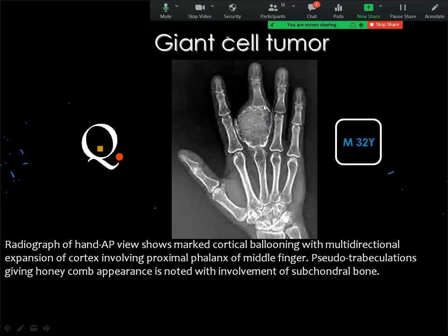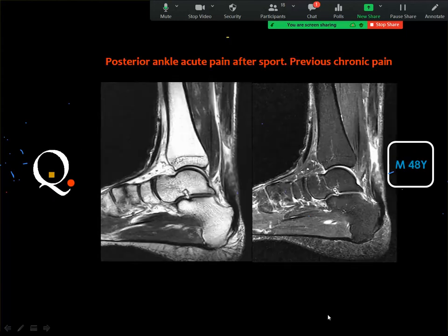The giant cell tumor may contain some trabeculae inside, but actually I went through the literature and I could not find a single criterion that can differentiate between enchondroma and giant cell tumor. So, in cases where the age is above the age of epiphyseal closure, then you may consider also giant cell tumor in the differential diagnosis of these tumors in the hand. Next case.